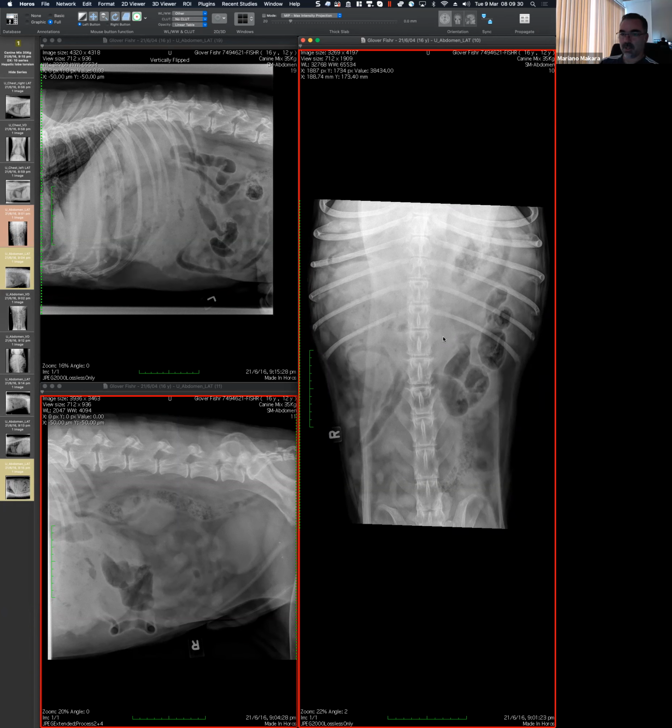But the one that I'm interested in you showing us, or somehow drawing on the images, is about the soft tissue, what you call a soft tissue opacity, and that issue you had in deciding if that is a real soft tissue something, or if it was the stomach. I'm interested in showing you, not in you being correct, but in showing us what you see and what your question mark is, what your thinking is, and how far you can go.